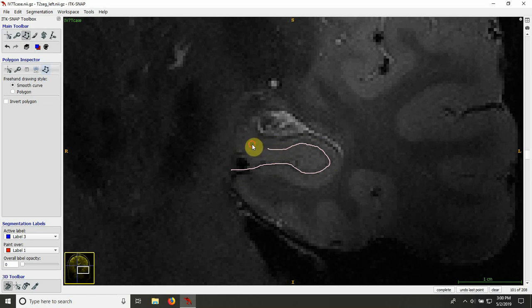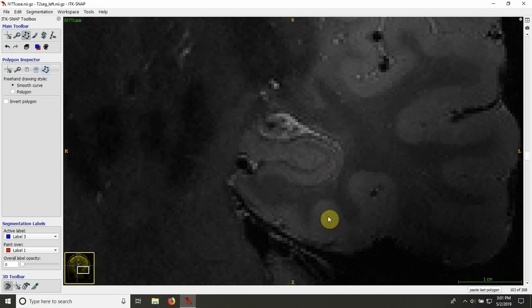And you can see the dark band to here. I'm not 100% sure, but I think it might be going like this. You can pretty clearly see it up to this point. So I think it's probably going like this. So on the next slice, I think, again, I see some voxels there.